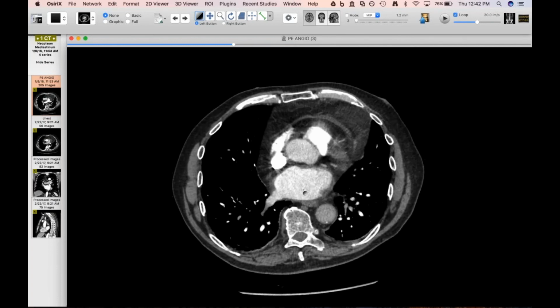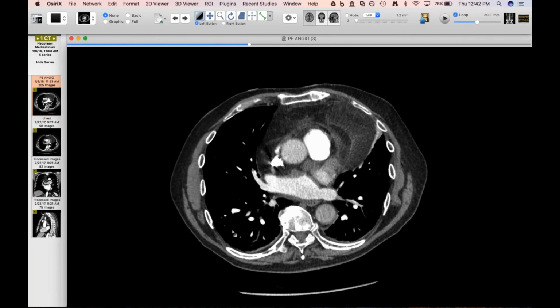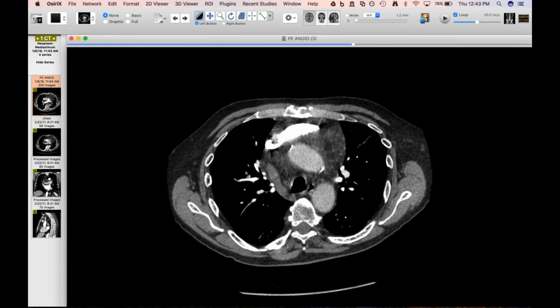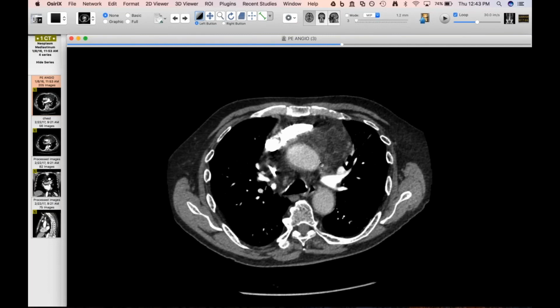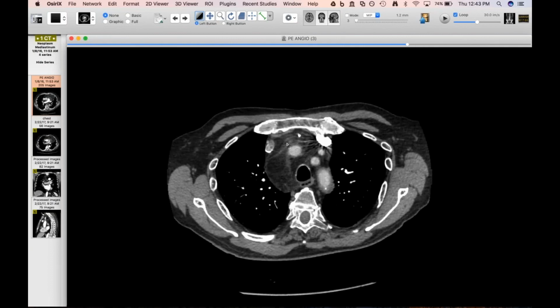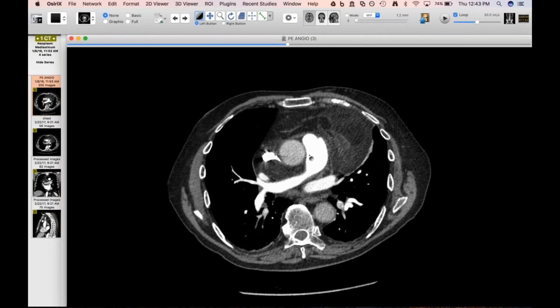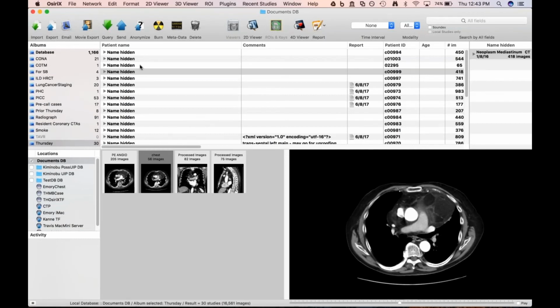But of course, if anybody wants to take a guess on what they think this is, I'll show Jeff's case that was exactly like this. Is it a liposarc? Yeah, this is a low-grade liposarc. And the question afterwards was, well, how do you know that based on these imaging? Because when I saw this, I was like, I think this is a liposarc. Because there isn't a lot of fat, or there isn't a lot of soft tissue in it, but it is infiltrating. It involves multiple compartments. And that was the reason I guessed that.